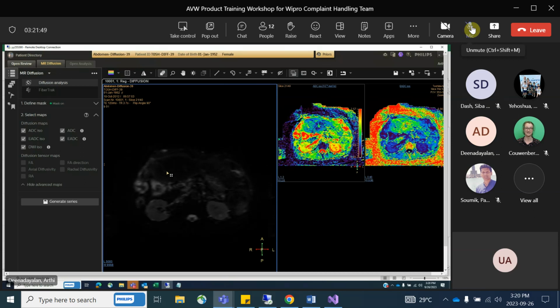Yes, the same can be verified in MMV. You can load it in MMV, check, and then reload it to the application.